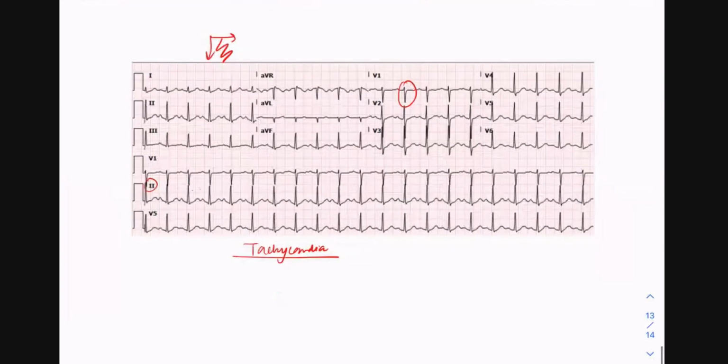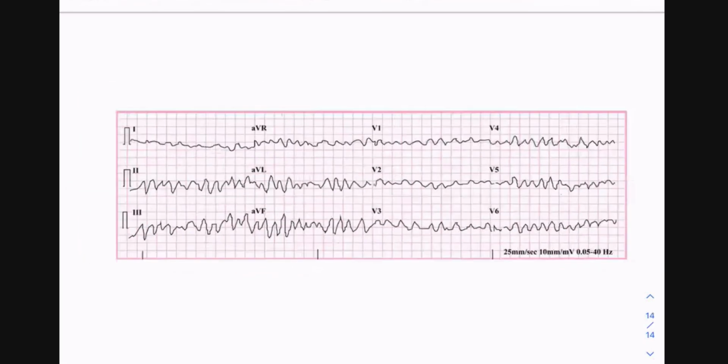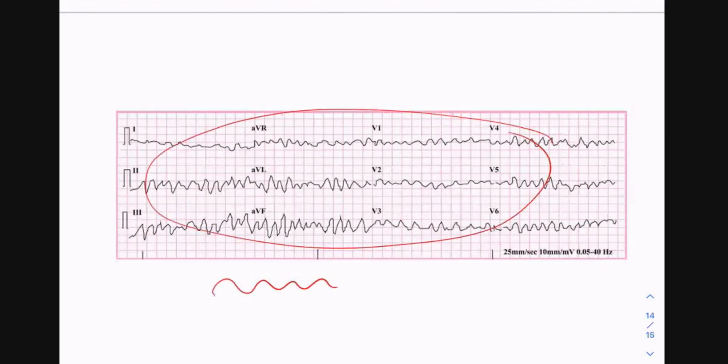I believe we have one more. This is a repetition. Remember, small squiggles is VFib. So I believe that's it.